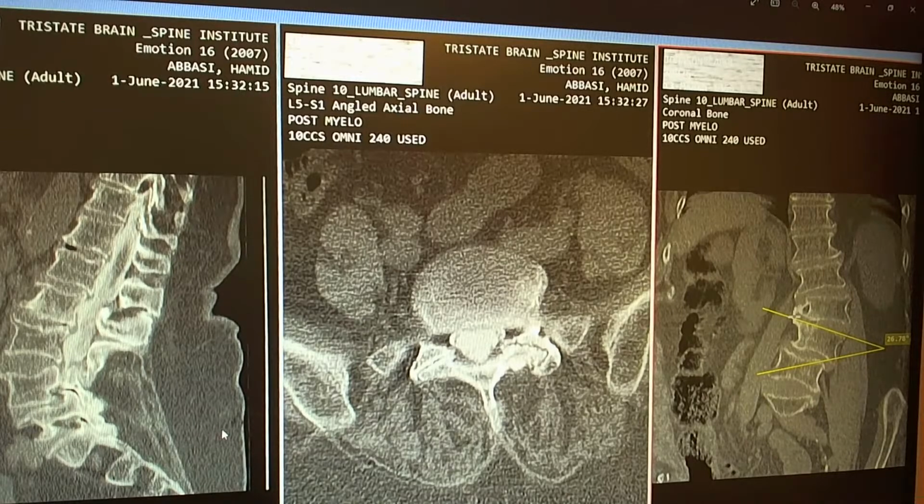Now, we had it in the last meeting. What do you think this structure is here and here? I want you to see and know that this is ilium. So we are dealing with the lower level, and never rely on one structure to make a decision. But this most likely is part of the large intestine. Okay, let's go to the next picture.